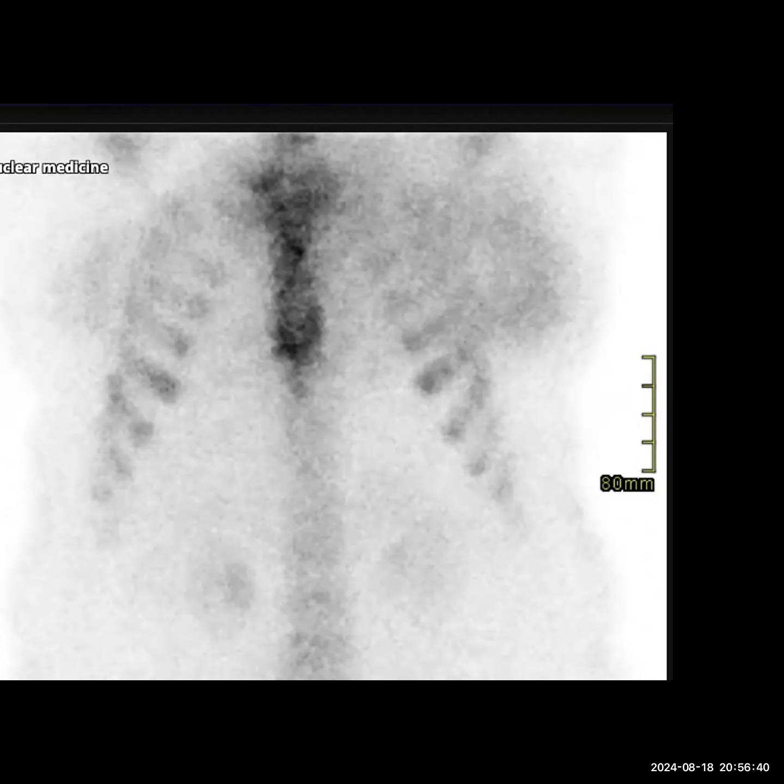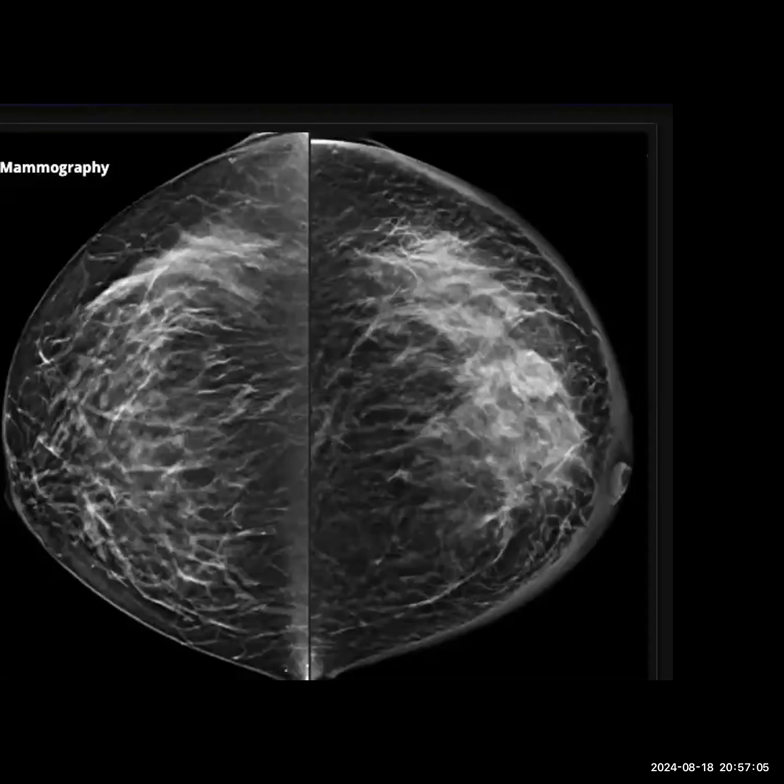I'm looking at zoomed up images. I can see that there is uptake. Other than that, if it was not a breast carcinoma, I would be thinking in terms of a chest wall mass. What would you like to do next? In my routine practice, I would correlate with any previous images available and any plain radiographs available and any previous CT chest available to rule out what this is.